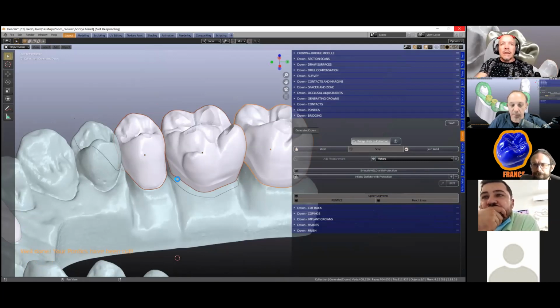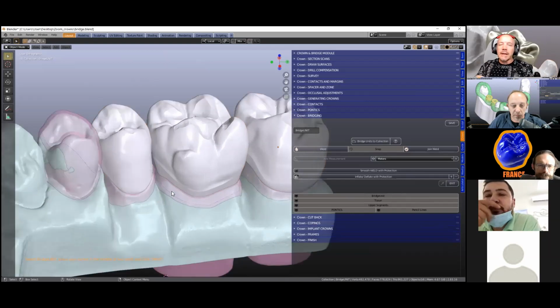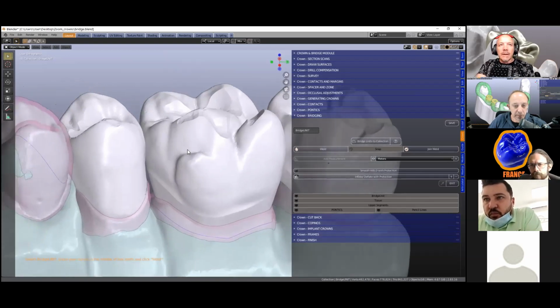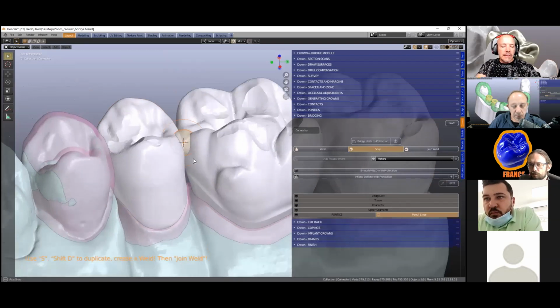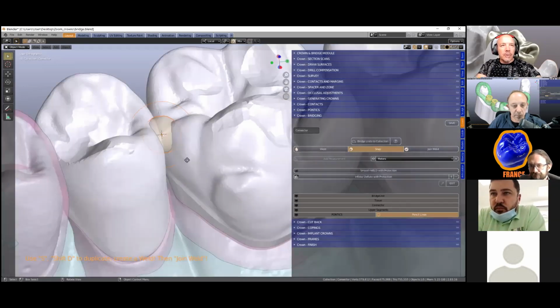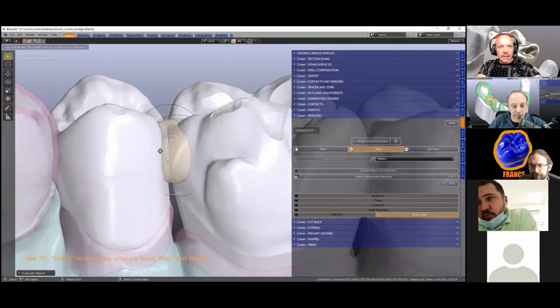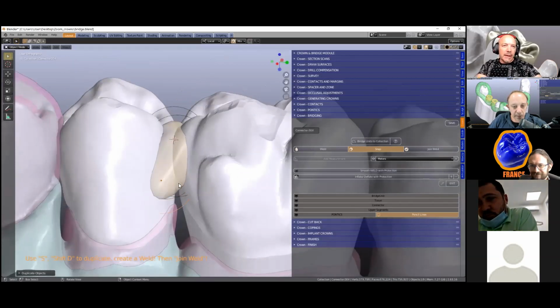And what it's doing now is creating an expanded sort of tissue model, which you can see has been offset, and that protects what we are doing underneath it as well. So here I'm going to put my weld, and this is really super cool because it goes shifty, and it's a bit like water. As you can see, it's just incredible how this works. I just love how Blender works.